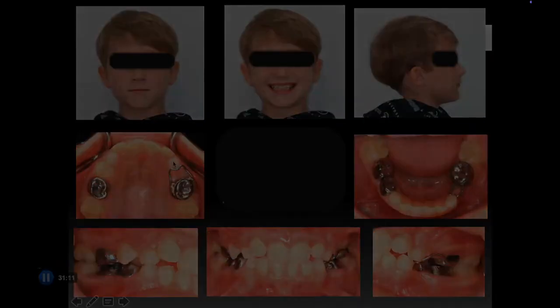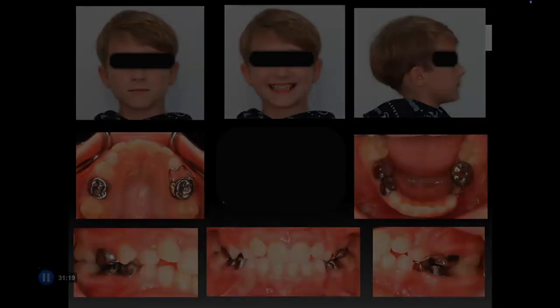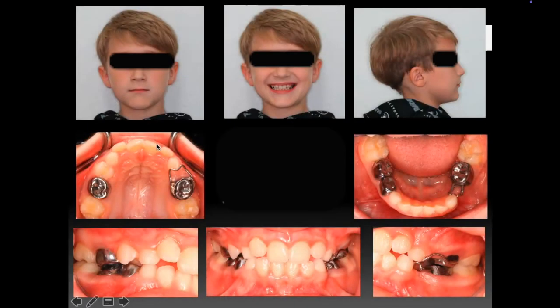Well, we'll just do dark here. Do you see that overlap right there? How many millimeters overlap is that, would you say? I'm going to say 2 to 3. I would say at least 1 to 2. How about here? How much do we have in between those two? Let's see if this will fix itself. 1 to 2.